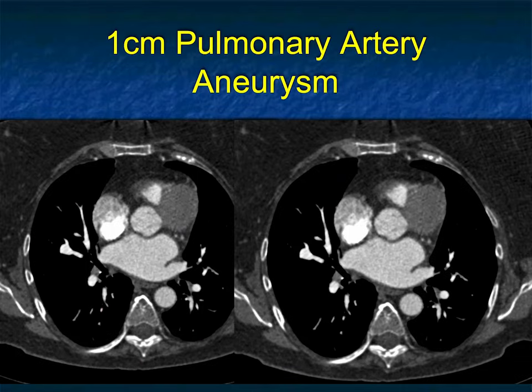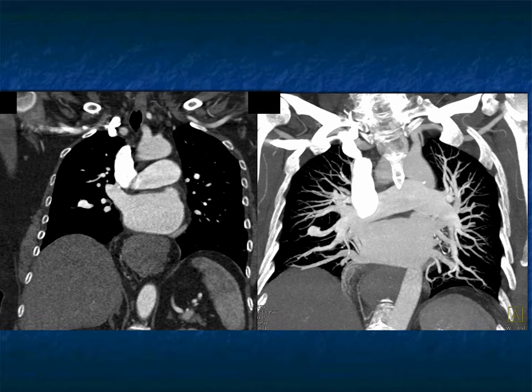On the flip side, pulmonary artery aneurysms can be small. Here's a pulmonary artery aneurysm, right lower lung. Now, one of the things you remember from reading chest x-rays, every once in a while you see a nodule very well defined and it looks like a vessel's going to it, and the differential between a nodule with maybe a feeding vessel or a pulmonary artery aneurysm is considered. CT was the gold standard and is the gold standard for proving which one of these is true.